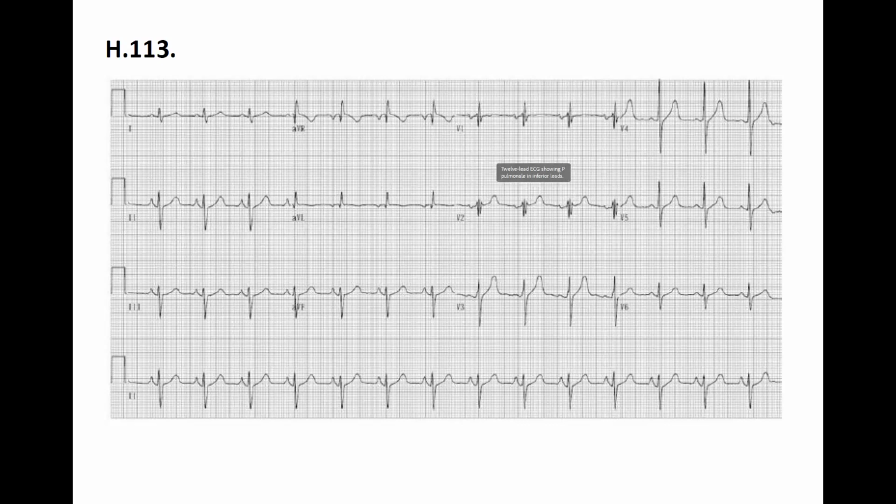I would say it's rhythmic. Yes. The heart rate, I can tell you, I am getting close to it. That means we do have 1, 2, 3, and a little bit more than 3. Okay, 3.5. The rate is around 80, 70. Well, 90. Make it 90.